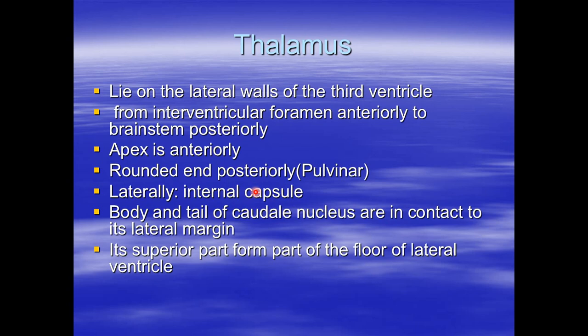Clinically, the caudothalamic groove is of very great importance in neonates. Does anybody know what the clinical significance of the caudothalamic groove in the neonates is? Does anybody have any idea? Let's see, someone is writing the answer. Yep, exactly. The most common site of intracranial hemorrhage in the neonate is at the caudothalamic groove.